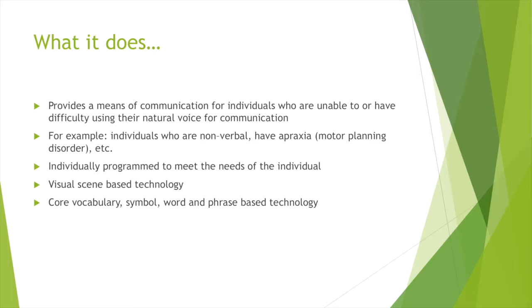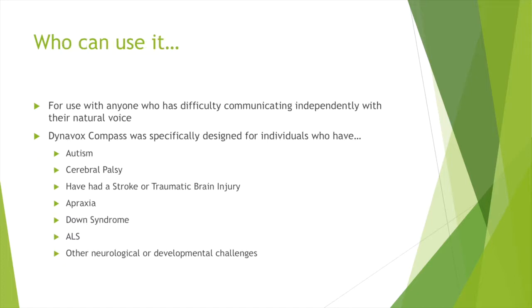This is a wonderful feature that the Dynavox Compass app offers because individuals who cannot use core vocabulary, don't do well with symbols, are not at that word level, can have a screen of a visual scene. So it can be a bathroom, a kitchen, any place, and hotspots are located on the screen. I'll show you more of this feature later on in the presentation also.